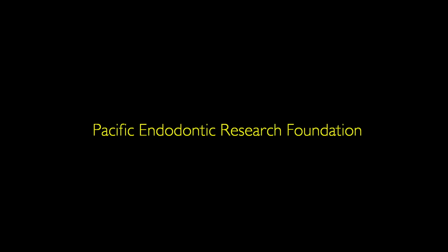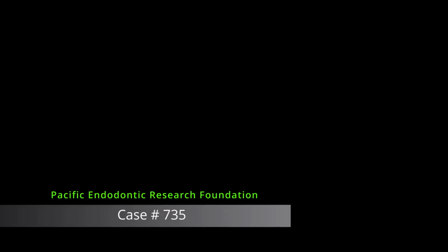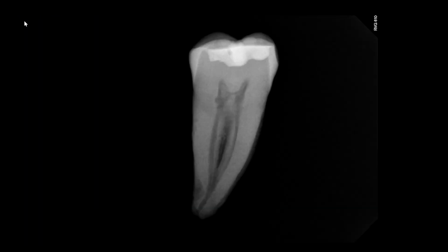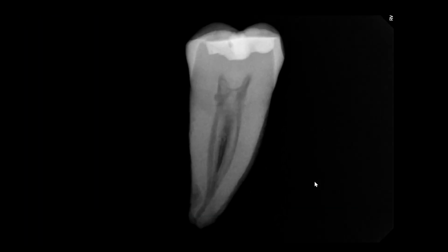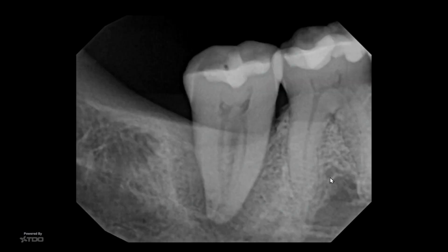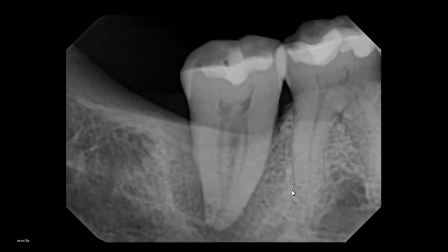This is a case that Pushpak sent me that's kind of interesting. As is their method, I have no knowledge of what was done with the case. I'm going to show this through TDO. And these are the x-rays that we took of the case when I got it. This is the radiograph Pushpak sent me showing the case.